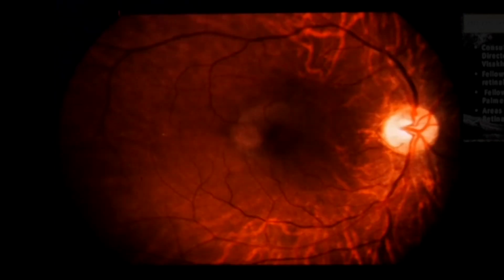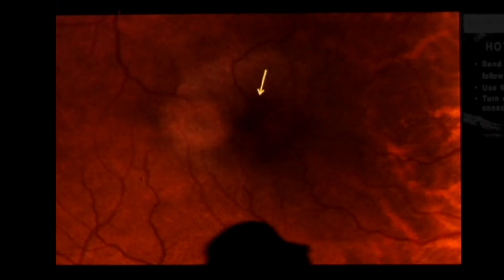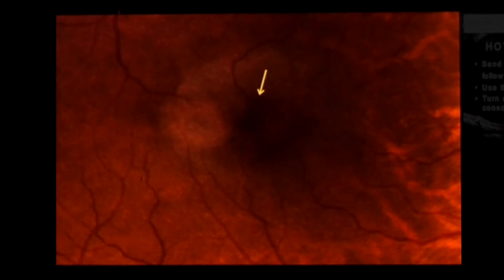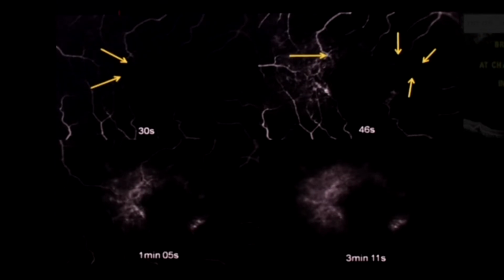Coming on to stage 3, along with the perifoveal graying, we also get to see the right angle venules, and sometimes you will be able to see a speck of hemorrhage, and this hemorrhage does not mean a development of neovascularization all the time. What was just seen temporal to the fovea can be involving all of the fovea when it comes to stage 3, and the dipping of the venules can be better appreciated on the fluorescein.